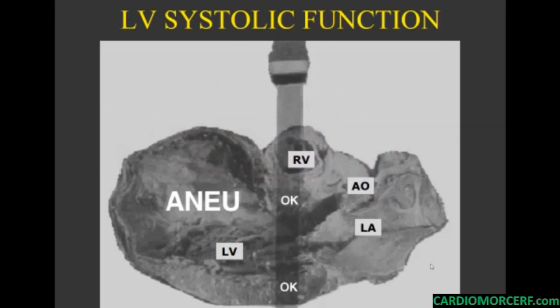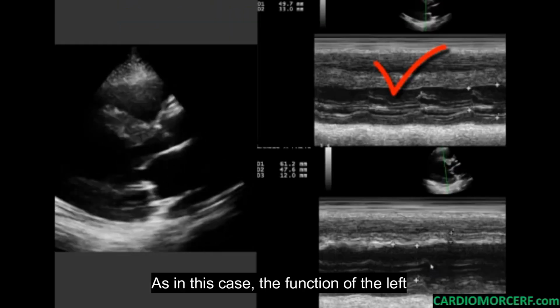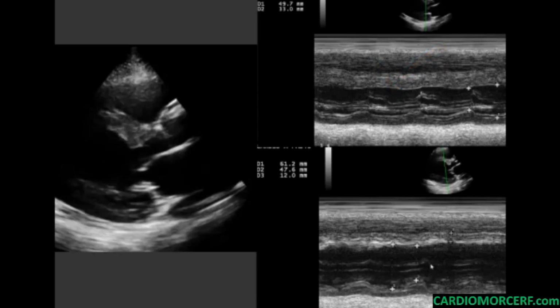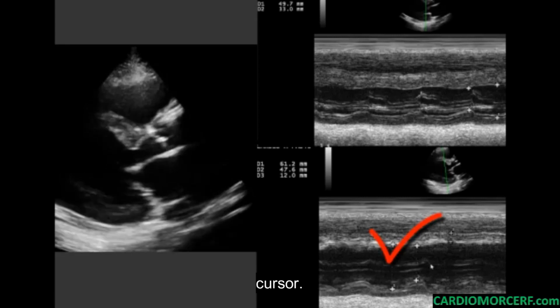Thank God, there is the eyeball. As in this case, the function of the left ventricle is normal by M mode at the mitral tips, but horrible at the position of the cursor.